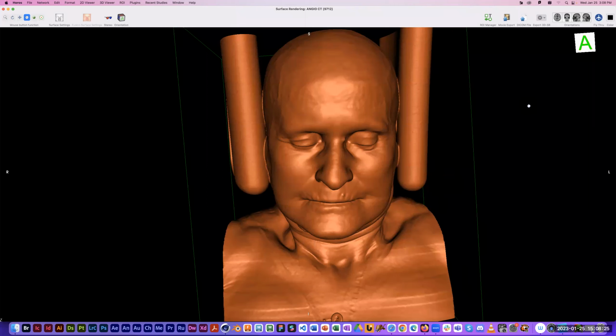Okay, real quick, I'm just going to show you one last thing with the surface model. Then I'm going to take a longer break, let you guys take a longer break and run around and troubleshoot any more issues. And then we'll come back after the break and I'll show you what to do with volume models, which are actually, I think, a lot more fun. But all I want to show you is that the surface models are the only things you can export in 3D. There should be a button here in the upper right corner where you can export.